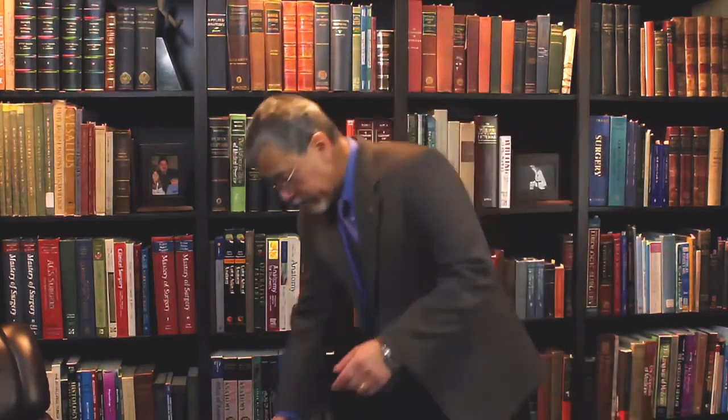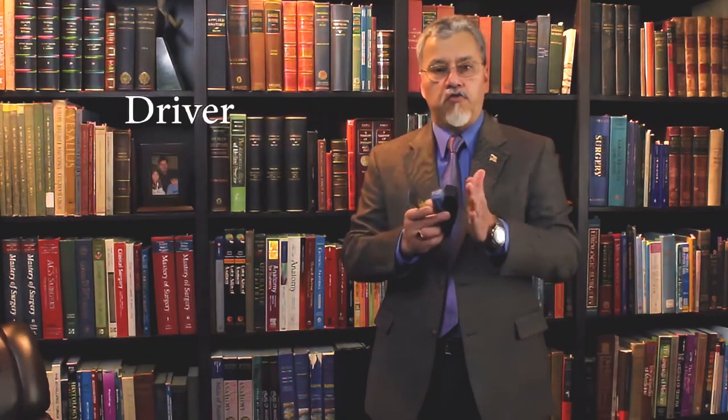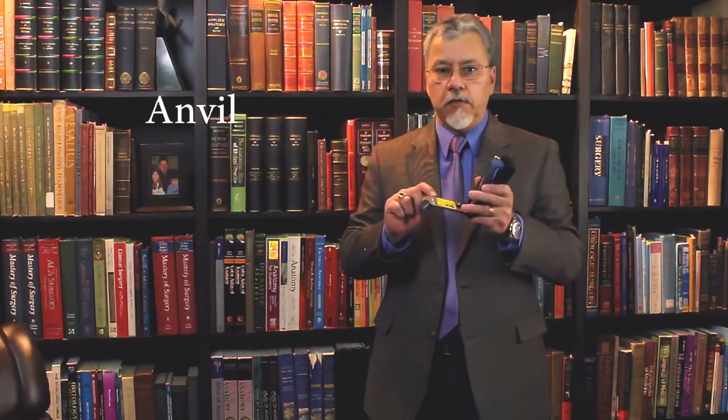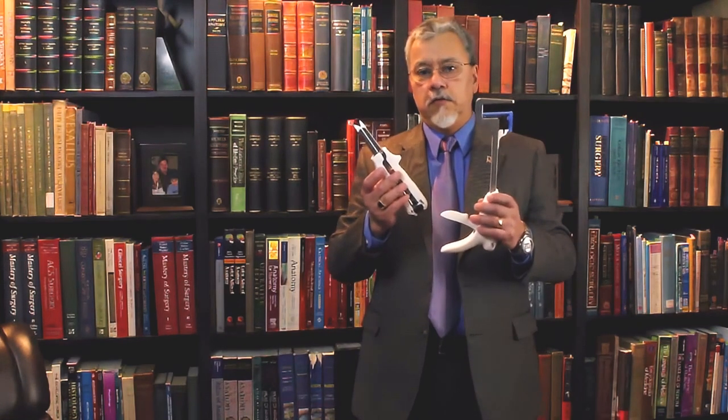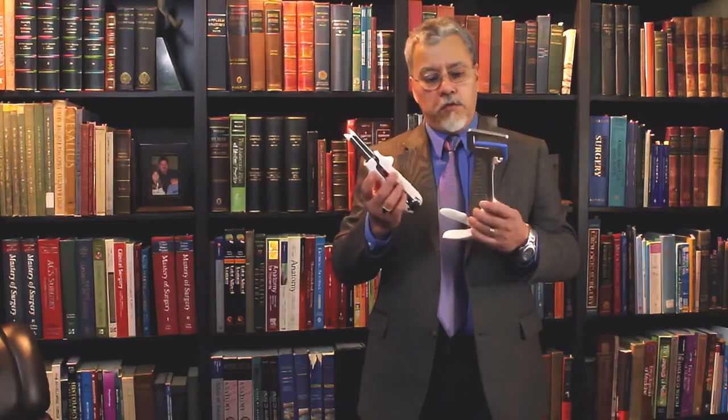So when we talk about staples, let's think about this type of staples and this type of stapler. A normal stapler contains a cartridge that holds the staples, a pushing element, a driver, and an anvil, which will form the staple like a letter B. Now, imagine the difference between this, which we use every day, and these. These are surgical staplers to be used in human surgery.